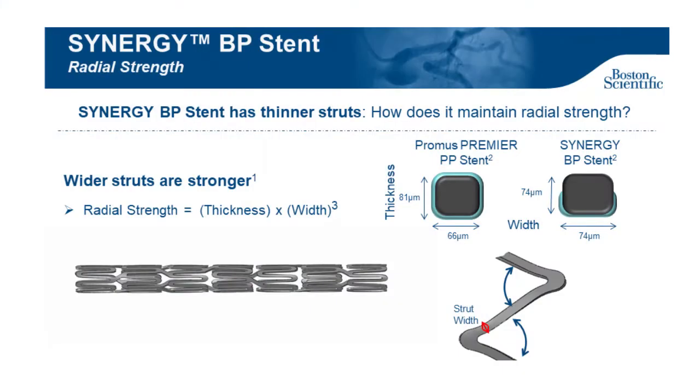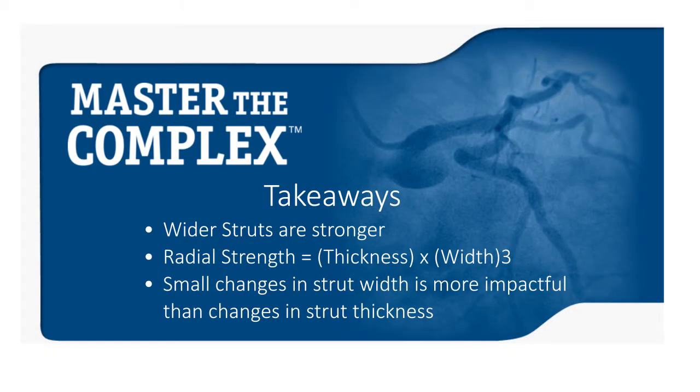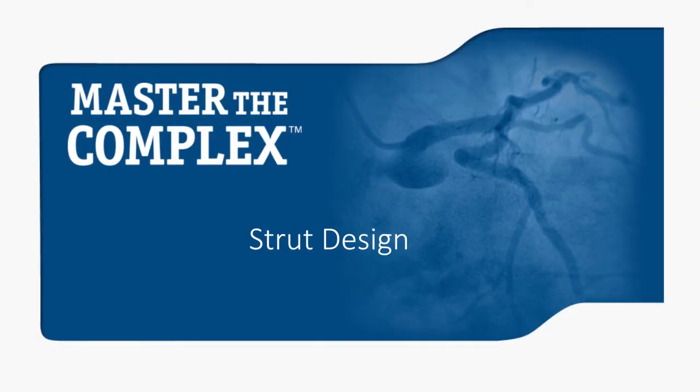Also, if you look at the cartoons in the upper right, you will see that although Synergy is thinner than Premier, the strut width is actually slightly wider. And this is across the board on all of the Synergy and Premier diameters. You will always see a slightly wider strut with Synergy. So therefore, any little bit of strength we lose by reducing the strut thickness, we make up for by having a wider strut.